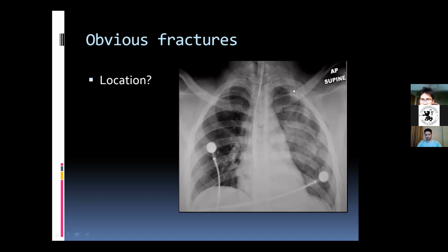So 1's here, 2's here, 3, 4. Yep, 5, 6, 7, 8 as well. And let me just move the chat box to one side. There is a little bit of a fracture on the 9th, but not too much. But yes, that's absolutely right. So 5, 6, 7, 8, and a little bit of 9 as well. And that's the way you're meant to describe it as well.